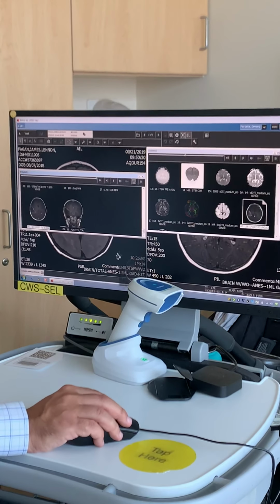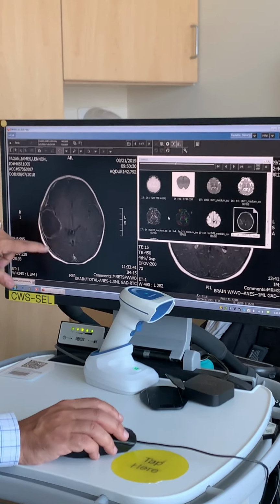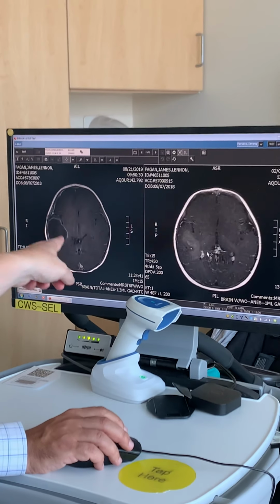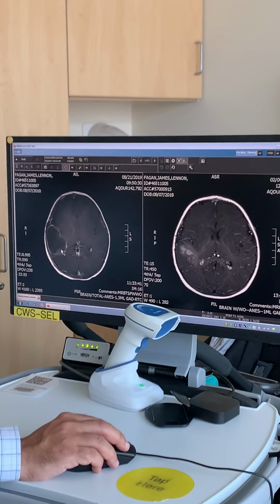And on this one, you're just seeing that thin line of scarring around, but you're not seeing what looks like this jutting out over here. But what about that area right there? Right here? Yeah, why is that thicker and sort of glowier?